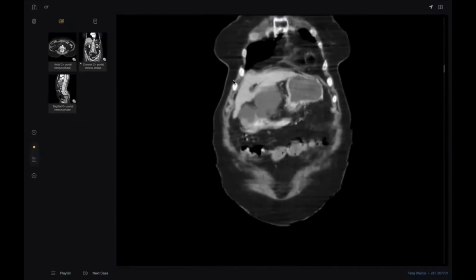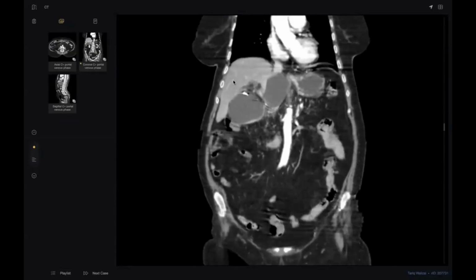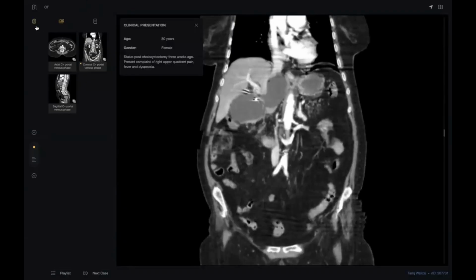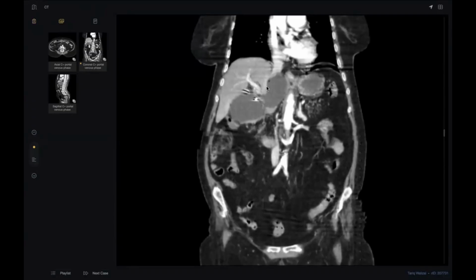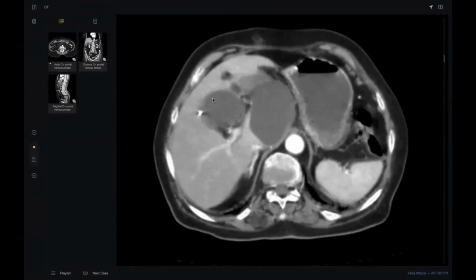I think the most reliable point in the diagnosis of abscess is the history. The patient has fever 3 weeks after the surgery. This is abnormal. The patient was good after the surgery for 1 week, 2 weeks, then developed a severe fever and right abdominal pain. So this is abscess until proven otherwise, for interventional drainage. Drainage by what? Either ultrasound. I think ultrasound here is not difficult.